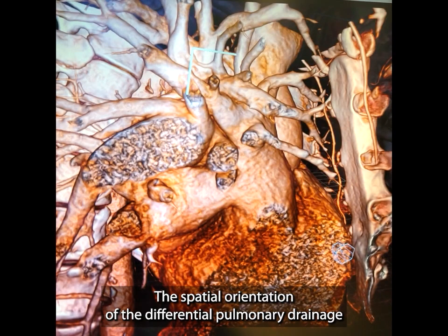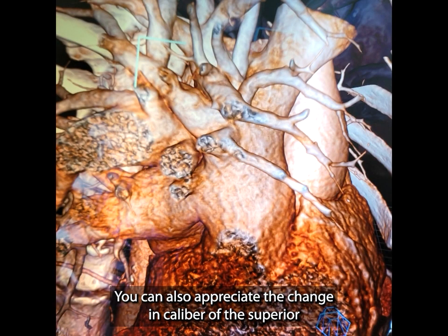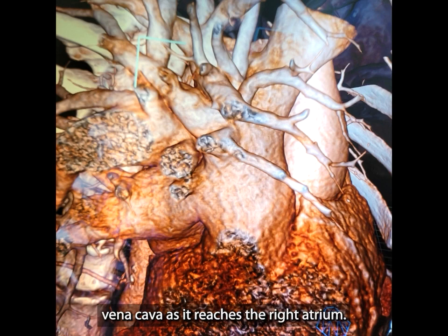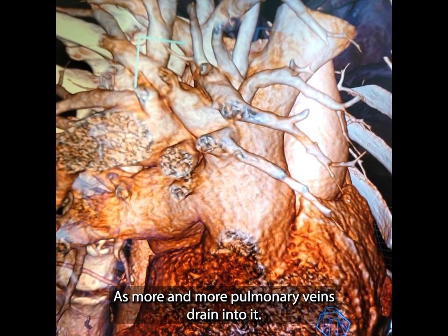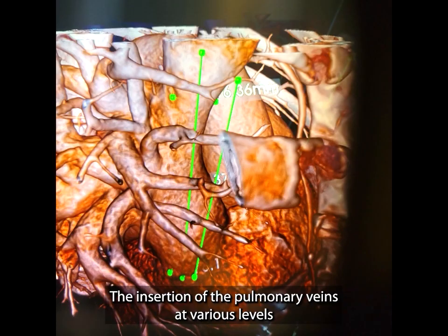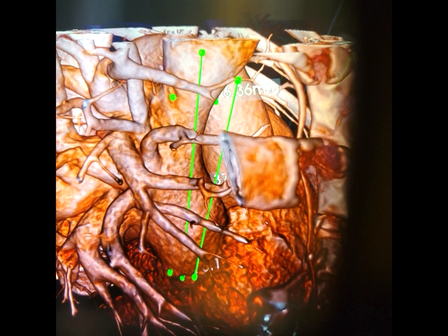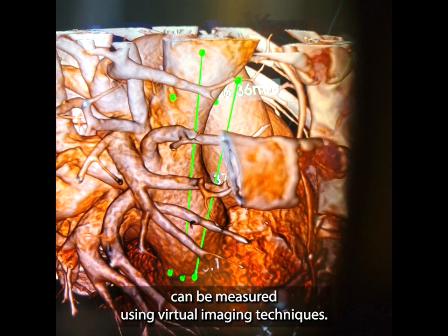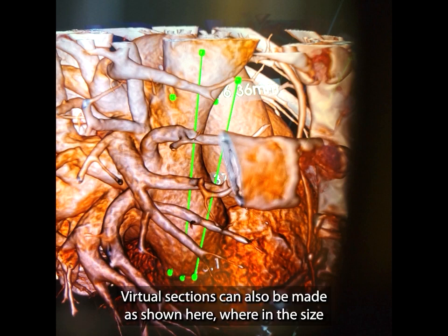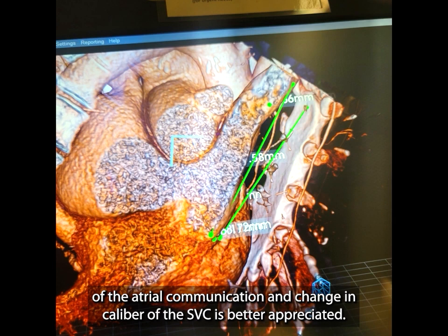In this picture, the spatial orientation of the differential pulmonary drainage is well appreciated. You can also appreciate the change in calibre of the superior vena cava as it reaches the right atrium, as more and more pulmonary veins drain into it. The insertion of the pulmonary veins at various levels and dimensions of the superior vena cava at each level can be measured using virtual imaging techniques. Virtual sections can also be made as shown here, wherein the size of the atrial communication and change in calibre of the SVC is better appreciated.